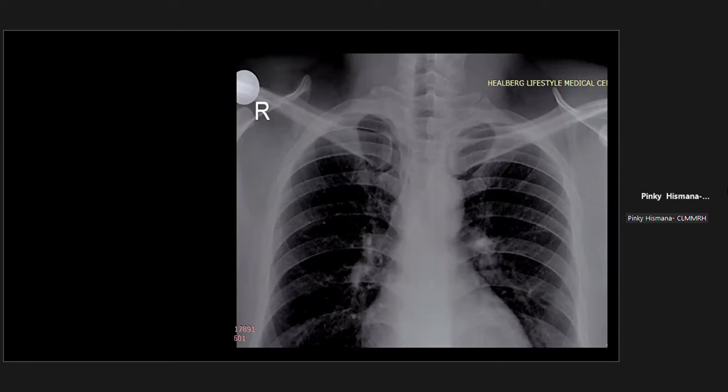So I guess we've also discussed airway, if I'm not mistaken. I don't know if we left off from this portion, but nevertheless, I'm just going to give a recap. So basically, what the yellow line now shows is your thoracic portion of the trachea. So that's your main airway. Then on the right side, we basically have the right main bronchus. So your trachea splits into the right and the left main bronchus. And I guess I've discussed yesterday the difference between both.